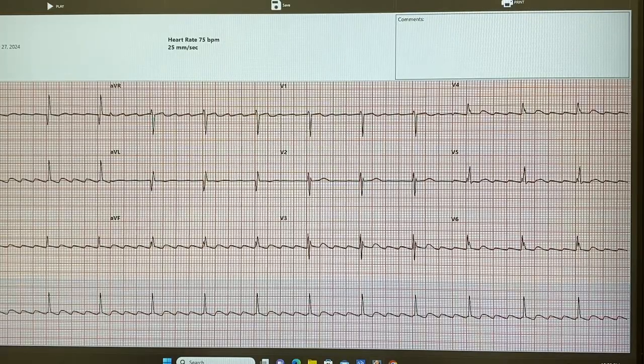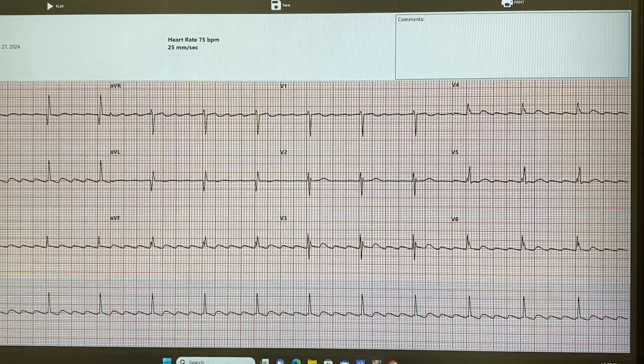So if you were to look at how they look and look at the criteria, do they look like normal P waves? No, because they're not smooth, and if I split it in half, they're not equal on both sides. Very good. Right now it's kind of looking like a right-sided enlargement, but we don't want to say that yet. It could be, but there's too many of them to tell you that that is the actual problem. But we know that there's an abnormality with the P.